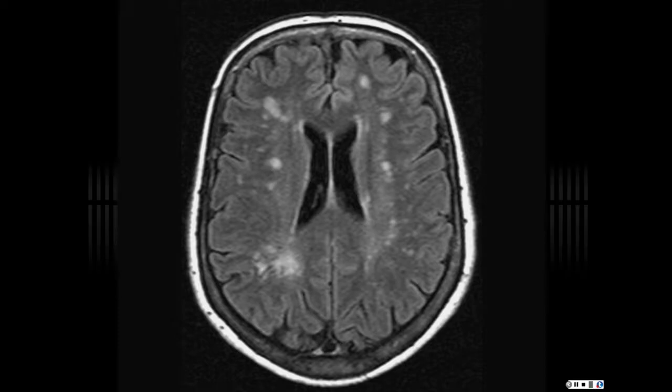This is normal. The ventricular system is normal. There's no shift in the midline, no mass effect. There are no extra-axial fluid collections. There are focal and diffuse areas of subcortical and periventricular white matter hyperintensity in both cerebral hemispheres. These are nonspecific and can be seen in a variety of clinical settings. If the patient is 50 or older, I'll say, and are most compatible with microvascular ischemic changes.